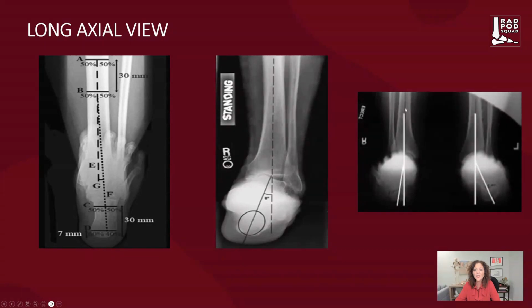And in fact, looking at this patient here where we see the tibia relative to the calcaneal floor angle, notice it's slightly valgus. And in this case, we can see it's even a greater degree of valgus. So even within the same patient, we are able to measure that difference in a weight-bearing X-ray.